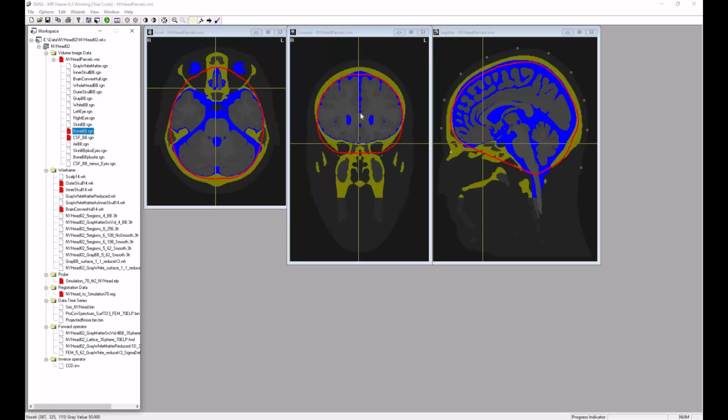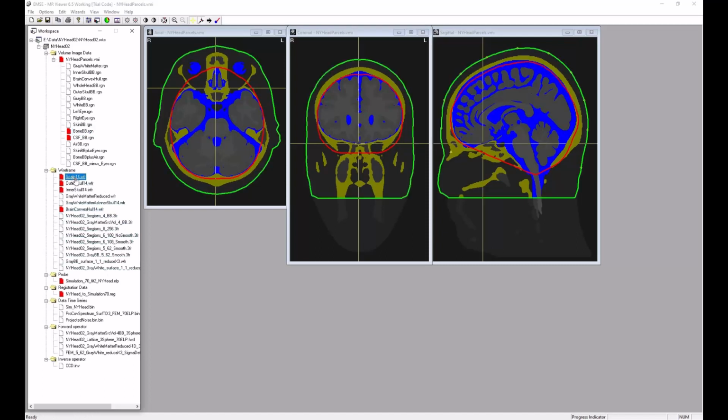And of course the main thing is we have the scalp, and essentially we're going to interpolate between. It's a little bit more complicated than just simple interpolation, because you can see sometimes the convex hull goes beyond. But essentially we're going to interpolate proportionately between these two known surfaces and the individual.